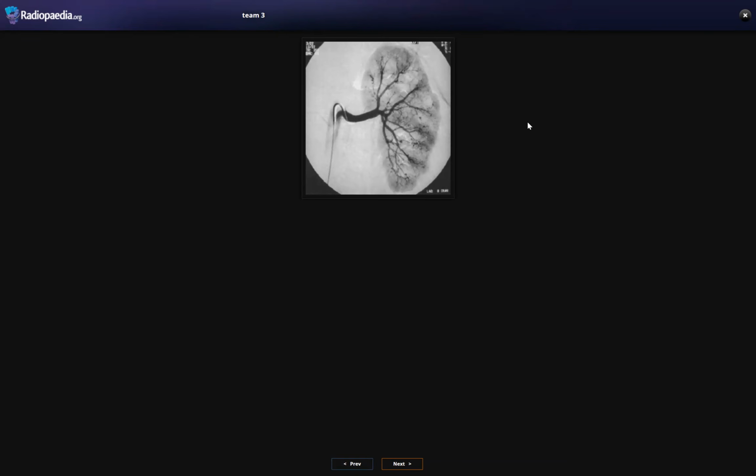So this is the angiography done through the left renal artery, and I could appreciate there is pruning of the segmental branches, and there are multiple contrast-filled outpouchings seen, which is likely consistent with multiple aneurysms. So the patient might have some vasculitis, could be polyarteritis nodosa, or polycystic kidney disease is also associated. Could this also explain the retroperitoneal hematoma? Yeah, yes. Okay.